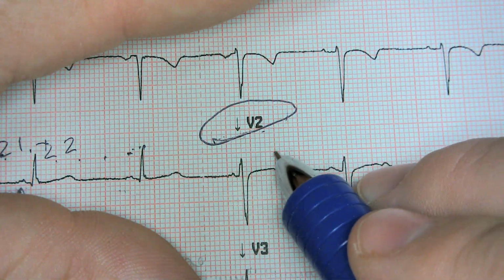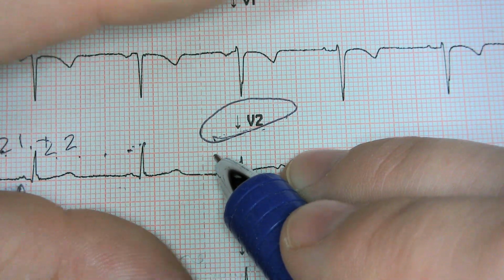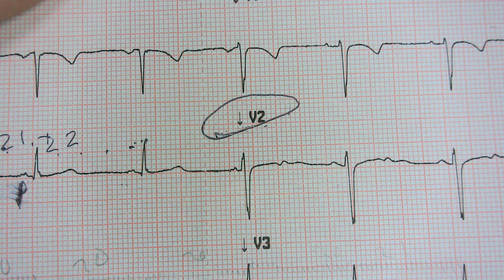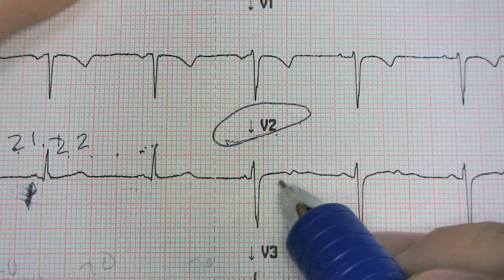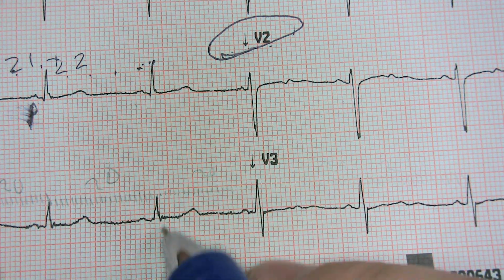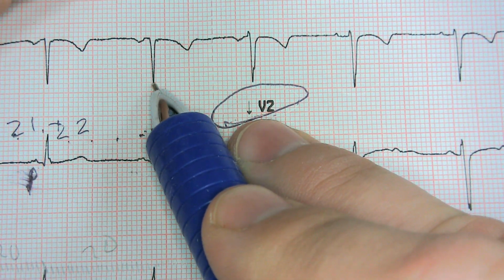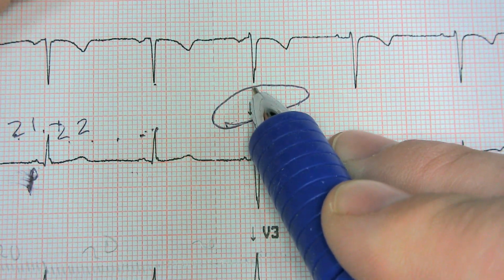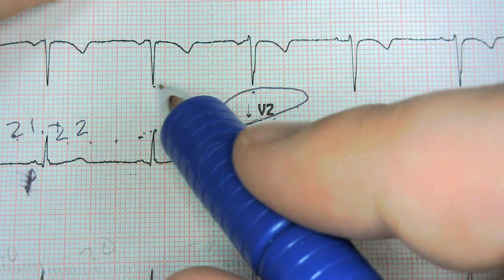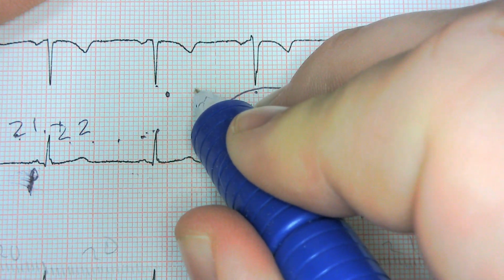All right, so now, this is the transition I was kind of hoping to avoid. So the way I get around when you see these crazy transitions is, once again, this is the exact same heartbeat, just different viewpoint. Does that make sense? So I'm going to use this one to make my life easier. Does that make sense? Because they're both pointing down. So 0, haven't gone anywhere.